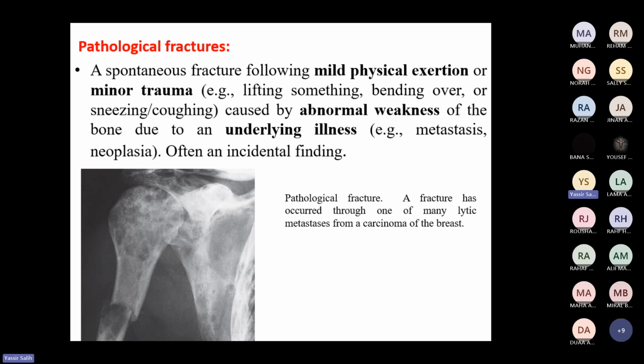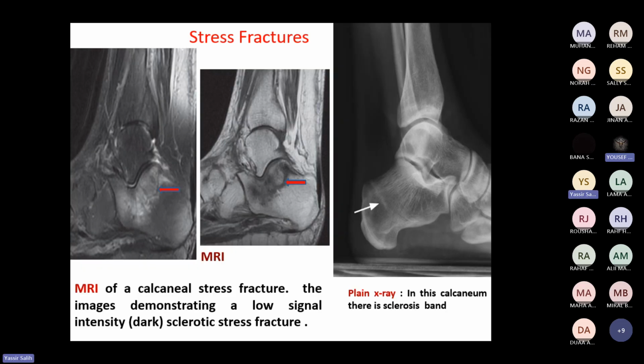We studied pathological fracture in the block, I think. Doctor, may I ask why there is increased intensity around it? Increased intensity around this, on the other image on the left. This is due to edema.